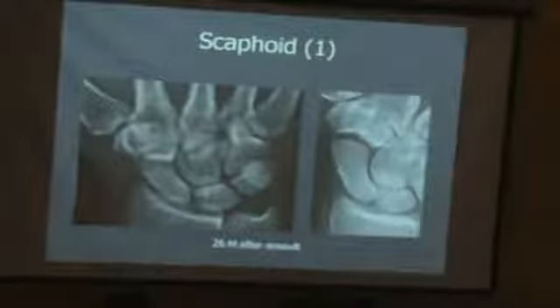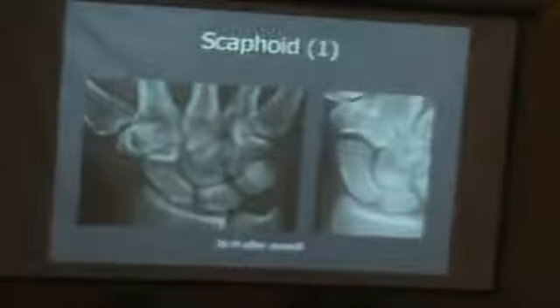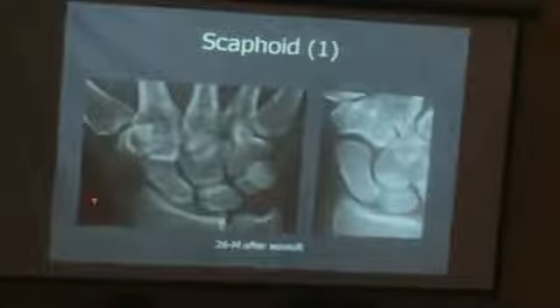So, some cases here together. And if there is anybody who sees something that I don't see, please let me know. This is actually the scaphoid.